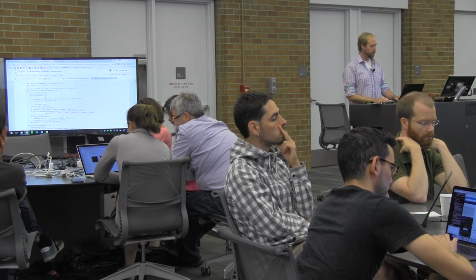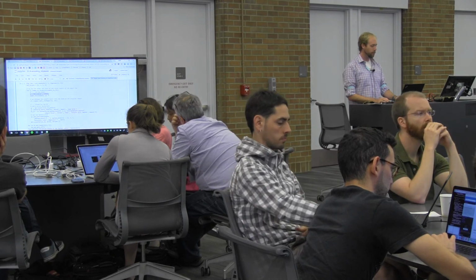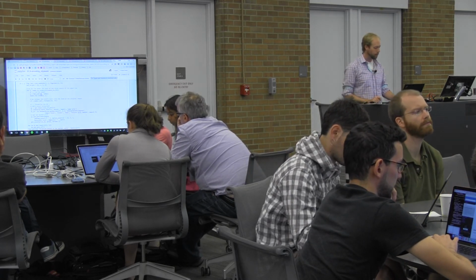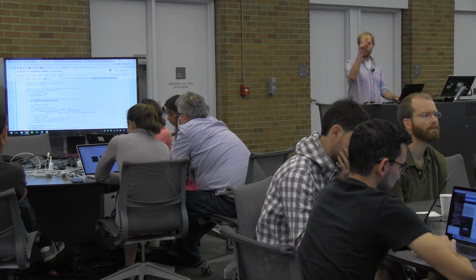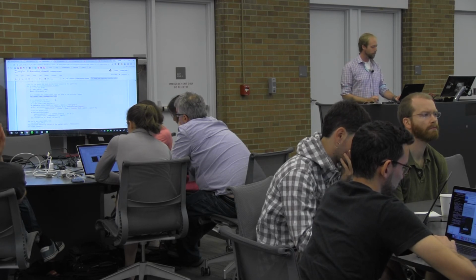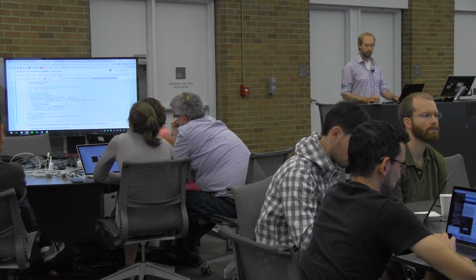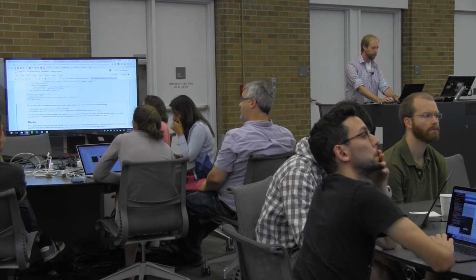So for each voxel, we're going to pull out the fMRI data for that voxel. We're going to fit a model with the pixel data as input and the fMRI data for one voxel as output. Then we're going to reshape the coefficients of that model so that they're in a 10 by 10 grid, which is the shape that the actual stimulus information came in. And then finally, we're going to visualize what that 10 by 10 grid looks like. And we're going to do that for each of the voxels that we've got there.